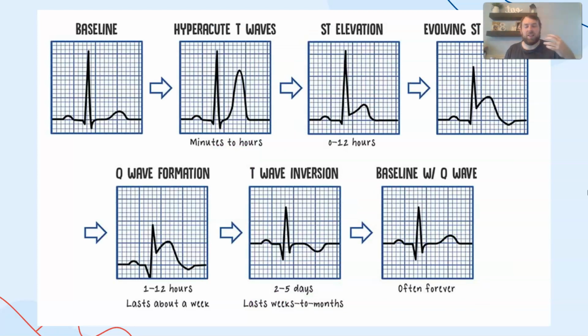And this particular thing can happen over many weeks to months, and even sometimes for a lifetime for an individual, where we'll see an abnormal EKG based on the event of a myocardial infarction. You can see that this myocardial infarction can be seen just hours after the event to still have that elevation in the ST wave here. And that will try to go back to normal and eventually even try to invert itself with the T wave.